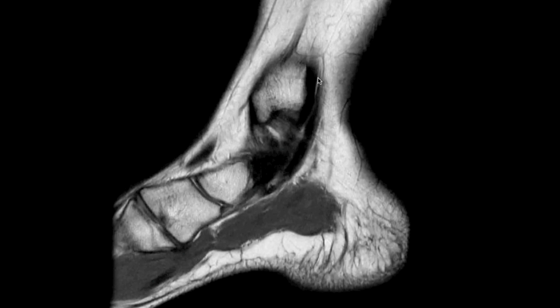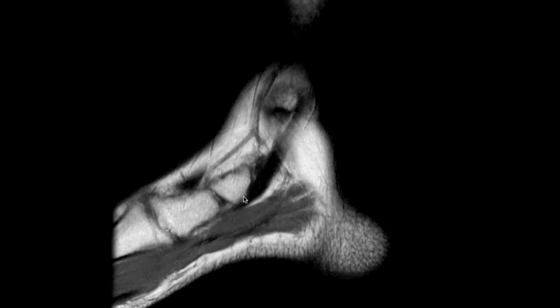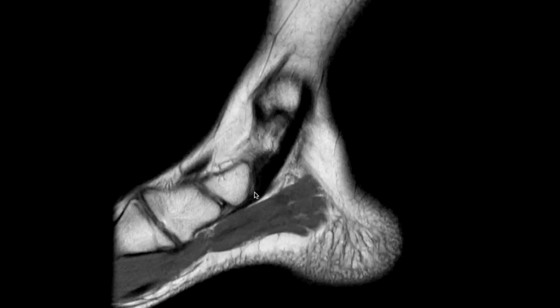So going along the medial aspect, just behind the medial malleolus, we see the posterior tibial tendon. And the posterior tibial tendon travels right next to this indentation, or this groove behind the medial malleolus. And these little protuberances are known as the colliculi. This is the anterior colliculus, and this is the posterior colliculus. And we see portions of the deltoid ligament complex arising from them. So the posterior tibial tendon is intimately associated with that posterior colliculus, which is right there. And you see nicely its main attachment into the medial aspect of the navicular.